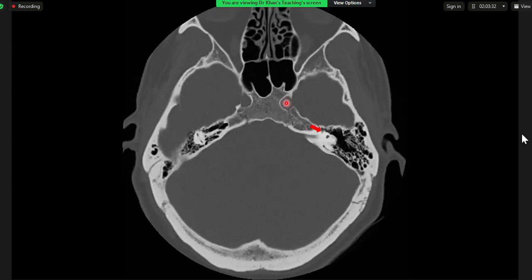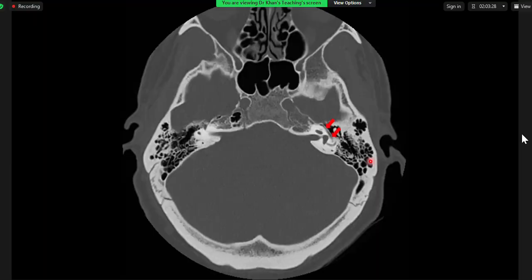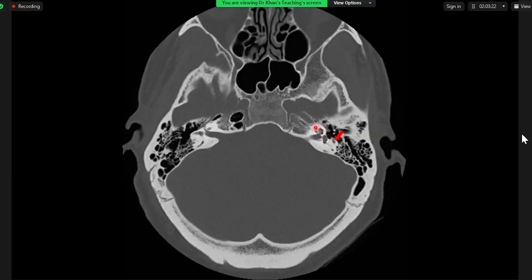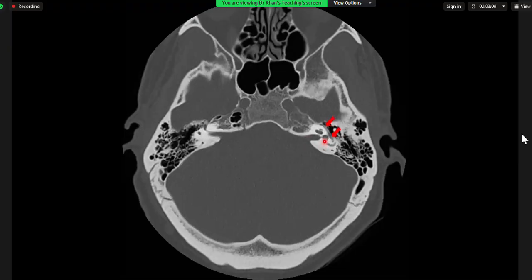Now, with that overview, let's go back to our friend, the facial nerve. So first of all, orient yourself. The landmark here is the cochlea, the flower. Medial to the flower, if you can see, the pons will be sitting here. So this is the internal auditory meatus and the canal. From the flower, the nerve which will come out is the cochlear nerve.